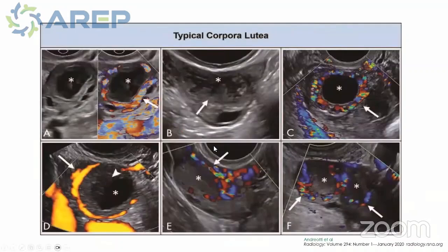So some more additional imaging examples of a corpus luteal cyst. Again, this is a fairly thick wall cyst with a relatively smooth inner margin. There are internal echoes, but without any vascularity and peripheral vascularity. On image B, it's a similar cyst with the crenulated margin. Image C here shows a very anechoic cyst, but with peripheral vascularity. Again, a corpus luteum with a solid appearing component, but there's no vascularity, and that's a retracting clot because it has a concave margin here. And on this image, again, a hypoechoic lesion with posterior acoustic enhancement and peripheral vascularity, and a similar lesion here.